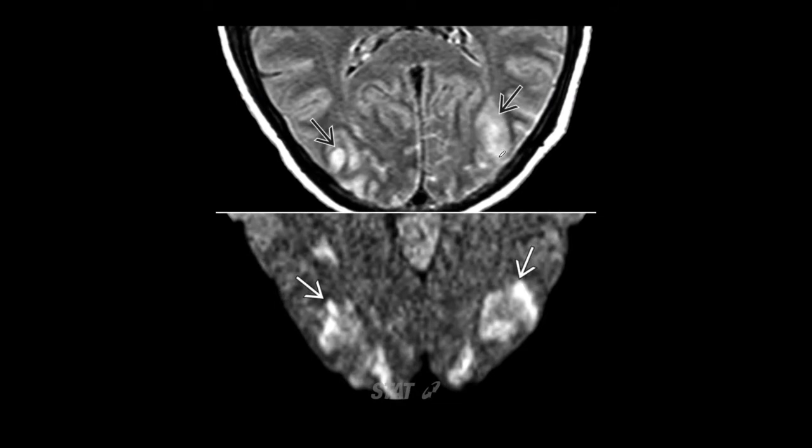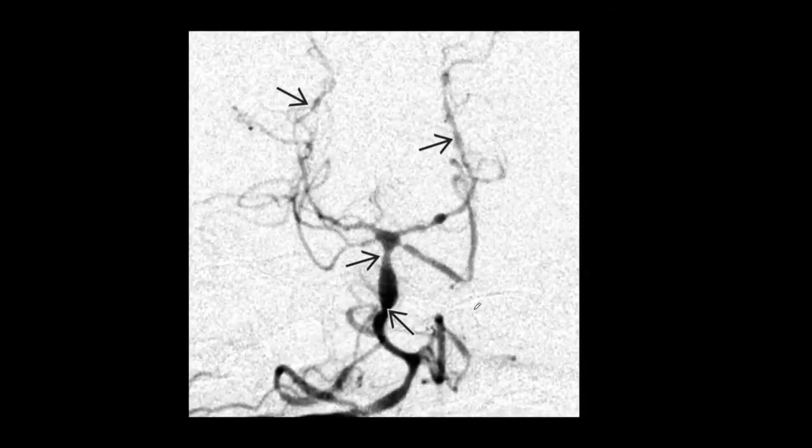These are restricted diffusion areas. This is a FLAIR sequence, which is T2-weighted, and this is DWI increase. It is in the region of the posterior aspect and bilateral occipital lobes, almost like how you would see in a PRES, right? Posterior reversible encephalopathy syndrome. Similarly, but when you look at the vessels, PRES is related to hypertension, right? Uncontrolled hypertension. Whereas in this, you will actually see multiple vessels with multiple narrowings. It's there involving, this is the basilar artery, right? You can check that. So you can see it in bilateral posterior cerebral arteries. These are the vertebral arteries, which are showing varying degrees of narrowing. That one is reversible cerebral vasoconstriction syndrome.